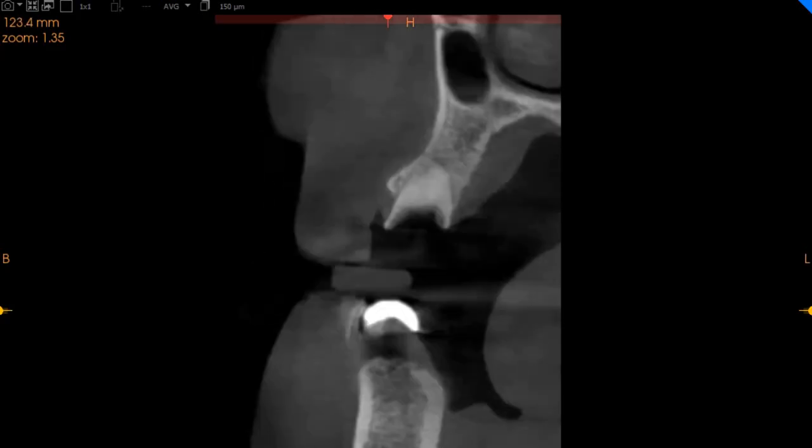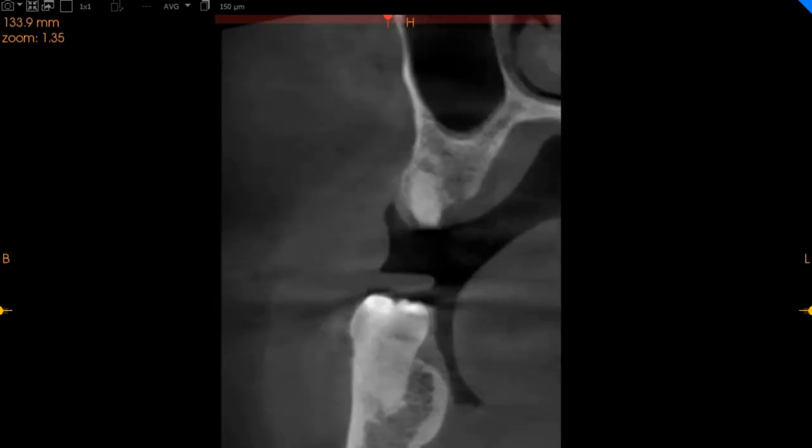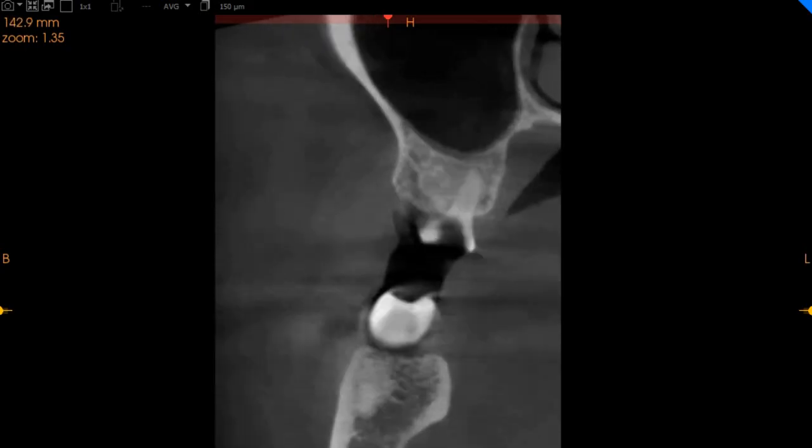Moving to the top left first premolar, again a BDR, ridge width of approximately 10 millimeters, 13 millimeters of ridge height. The region of the 5 is edentulous. We've got D3 quality bone, 10 millimeters of width, 12 millimeters of height, and in the region of the 6, we've got two BDRs with periapical infection.